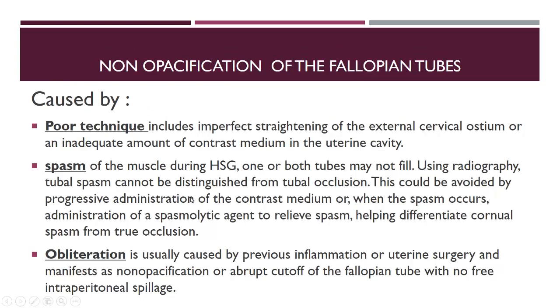Non-opacification of the fallopian tubes can be caused, most commonly, by poor technique, imperfect straightening of the external cervical ostium, or an inadequate amount of contrast in the uterine cavity. If you have an underfilled uterine cavity, you cannot comment on the fallopian tube filling.